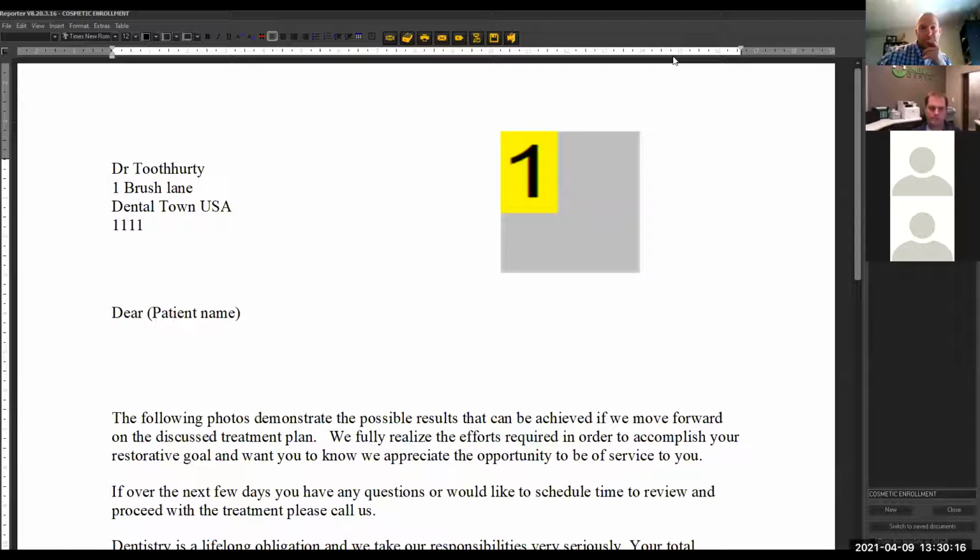Hold on. How do I get this out of here? No. No. Yeah, there we go.